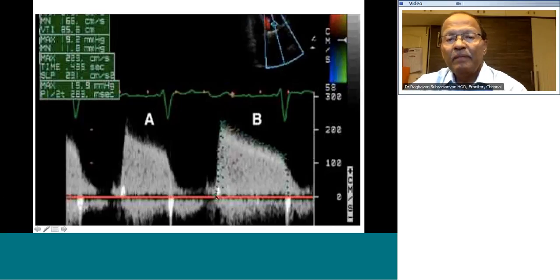Now, it shows that the diastolic velocities across the mitral valve are increased. It is increased because normal velocities across the mitral valve are in the range of less than 1 to 1.2 meters per second. Here the peak velocity is going up to 2.5 meters per second. So the velocity is increased. It is not only increased, it is very intense. You can see that the whole envelope is filled up by the echo noise.